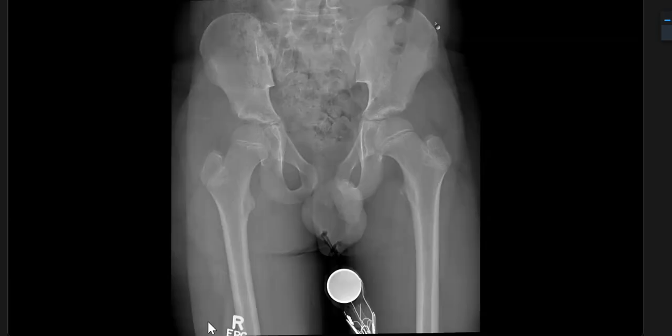I've been presented with a frontal radiograph of the pelvis of a pediatric age group child who has been limping. I can appreciate there is a pubic symphysis widening. There are normally opacified bilateral femoral heads. The adjacent pubic bones are normal. A subtle bony osteopenia is noted. There is some sclerosis in the roof of the left acetabulum. Within the sacrum, I cannot appreciate any abnormal lucencies.